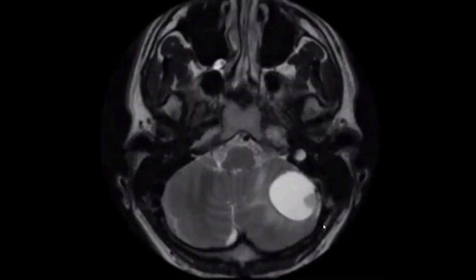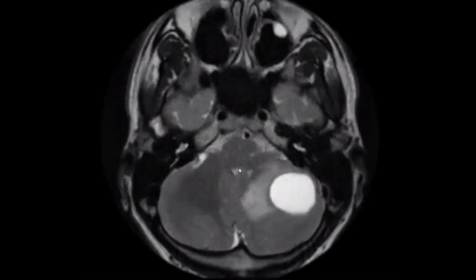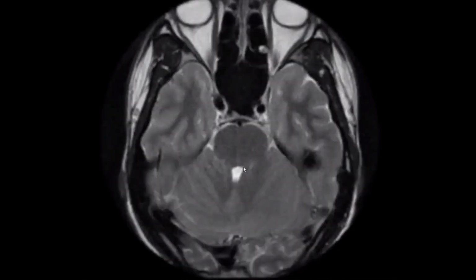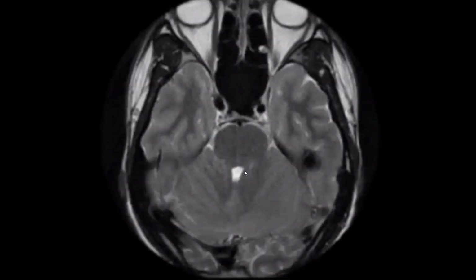Candidate number 15. No, I'm good. Okay. Go on. I have presented with axial T2. I couldn't hear you very well. Can you please raise your voice? I have presented with axial T2 MRI. Yes. Okay. Very nice.